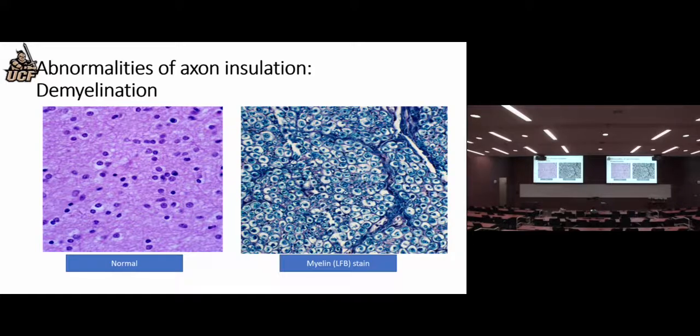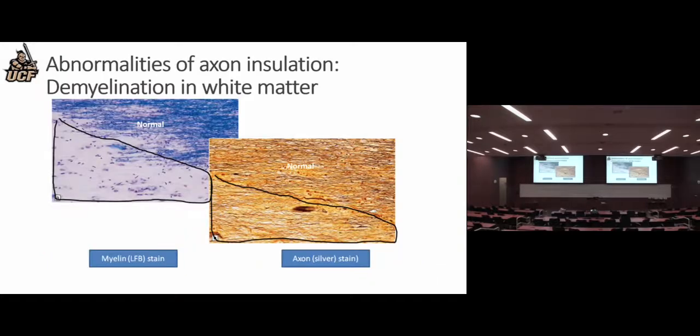And this just shows normal myelin. Normal, see the oligos. Here's the Luxol fast blue stain. You see there's a lot of myelin there. Oh, here's one that shows the differentiation. Normal, and here, Luxol fast blue stains this all blue, but virtually none in the demyelinated area.